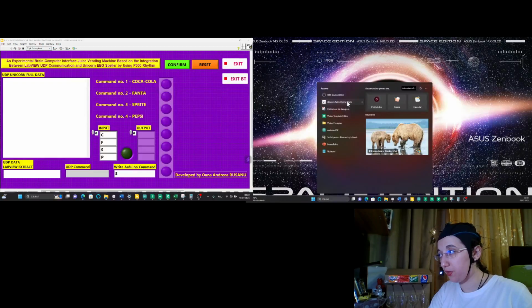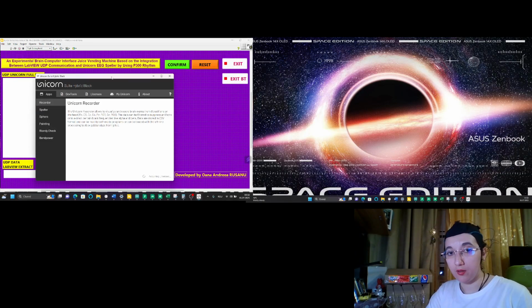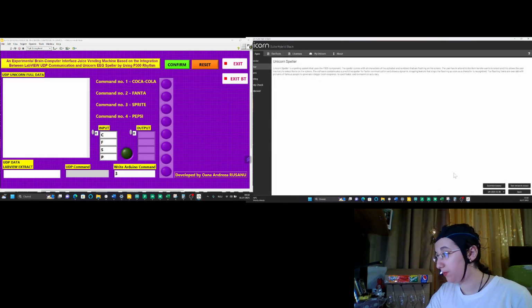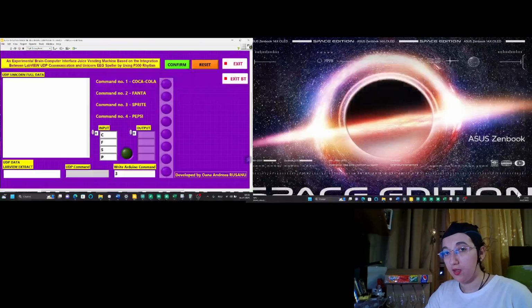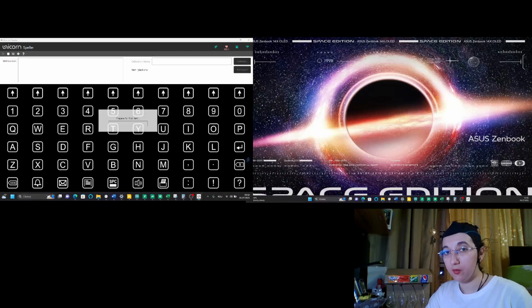It's the official suite offered by g.tec. This is a very useful application, even if we need to pay a license. But this application offers us the possibility of detecting the P300 event related potential, and also it's possible to customize our own boards.